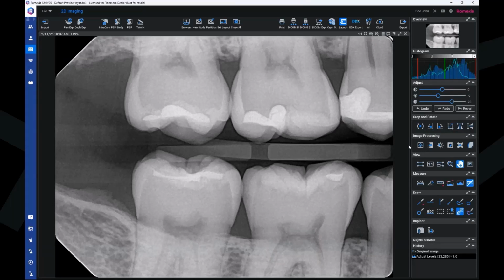Then below that, there's a different kind of filters. I will show the clarify filter on the panoramic images because it makes more sense there. But what we have next is the noise removal, the speckle. So this is just, you click once and it does the noise removal to the image. And now you can see, like I mentioned before, that it added here to the history a new line with the noise removal. So all the changes that you make to the image processing are saved here.